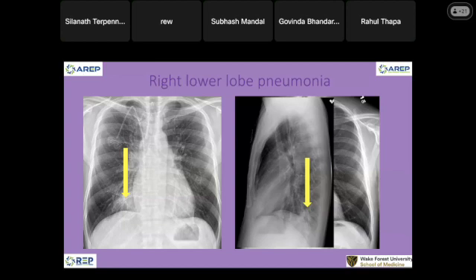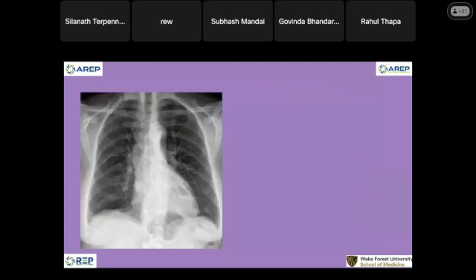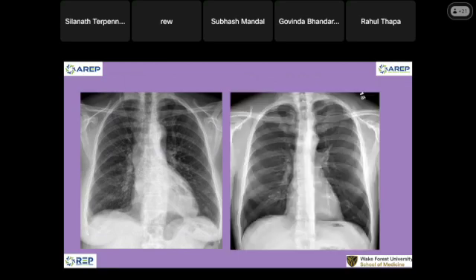I'm sorry that I did not put them in the same image. You look for something asymmetric. Look for something asymmetric. Normally the aorta here is symmetric on both sides. Okay, what about this one? Compared to my normal aorta. And then the aorta is coming down here, nice looking.